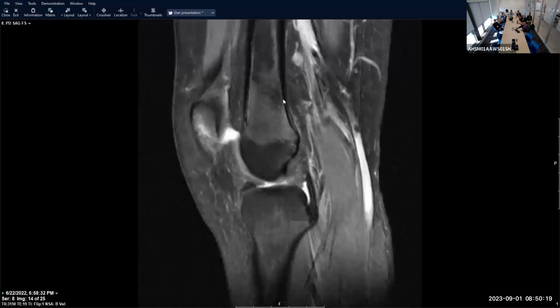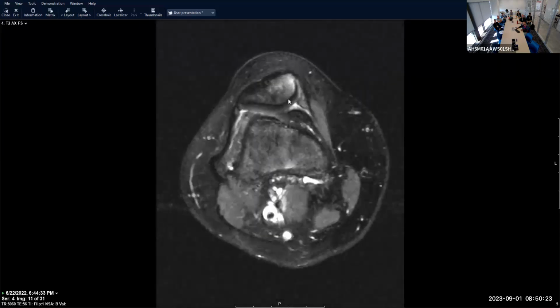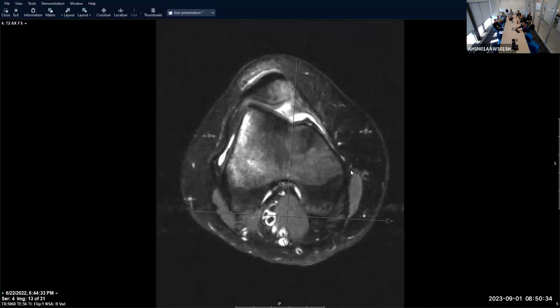Okay, that was the patellar tracking. Let's talk about the MPFL too. So we want to go basically to the middle slice where the medial patellofemoral retinaculum attaches to the patella. It's probably here. The MPFL can be sprained either at the patellar attachment generally or the femoral condylar attachment. You can see why someone would like the T1s or the non-fat suppressed sequences here, because if I'm looking for a dark ligament at its femoral attachment, but all the fat is dark next to it, I have no contrast between the normal structure that I'm looking at and the adjacent tissue.